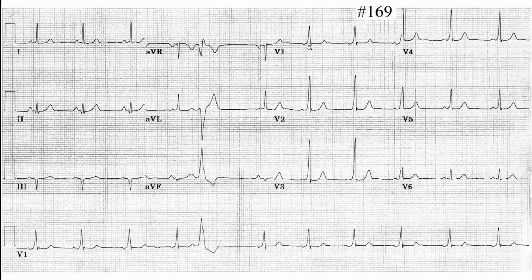It's wide in the abnormal one we talked about earlier, but it looks a bit wide in V3 maybe. In the chest leads you can see a little widening in the first phase, something like here, and here as well, but not too nice. So what about the PR here? Very short? I can enlarge it. Yes, that's very good.